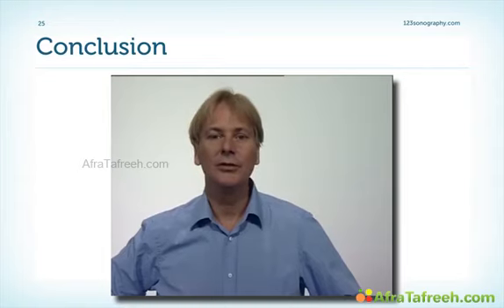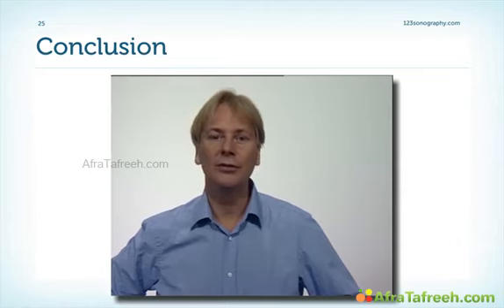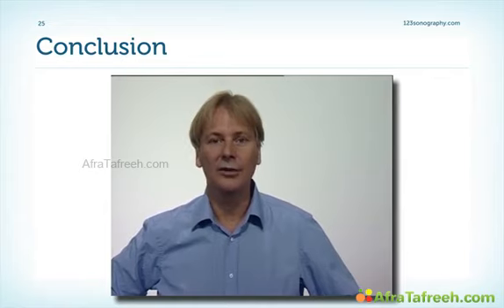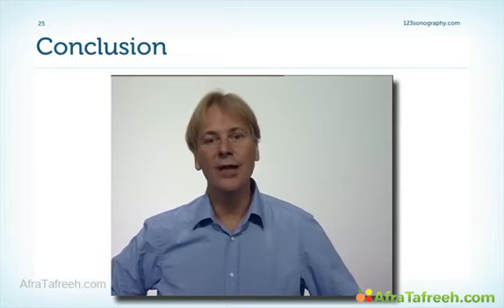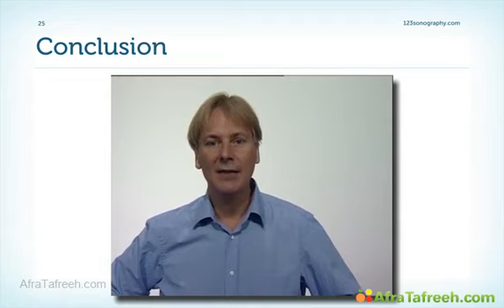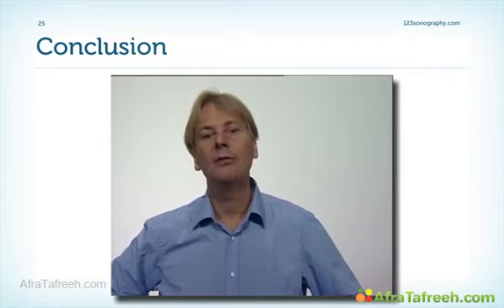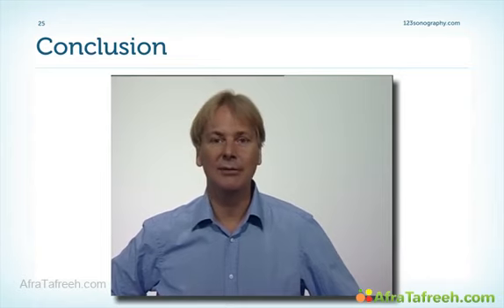So in conclusion, you can see that you can visualize the aorta with the help of the standard views and maybe using a few tricks. If you measure, all you have to do is look at the ascending aorta. If you have a pathology there, then of course you have to also look at the other segments. And if you have discrepancies between transthoracic echo and other imaging modalities, these can be explained by the fact that, first of all, we are using the leading edge method, and because sometimes the aorta is measured tangentially, and also because a different segment might be measured with the help of CT, a segment which is not visible to you with the help of echo.